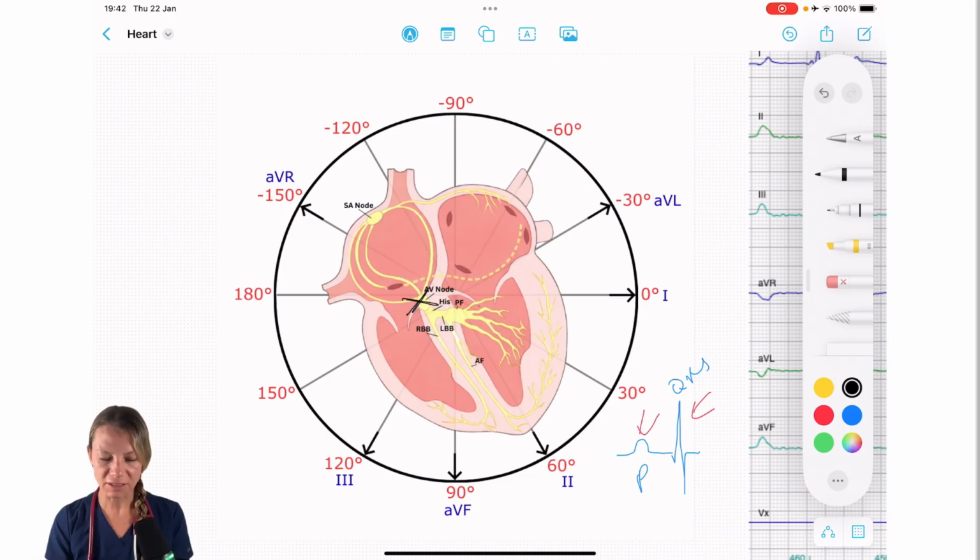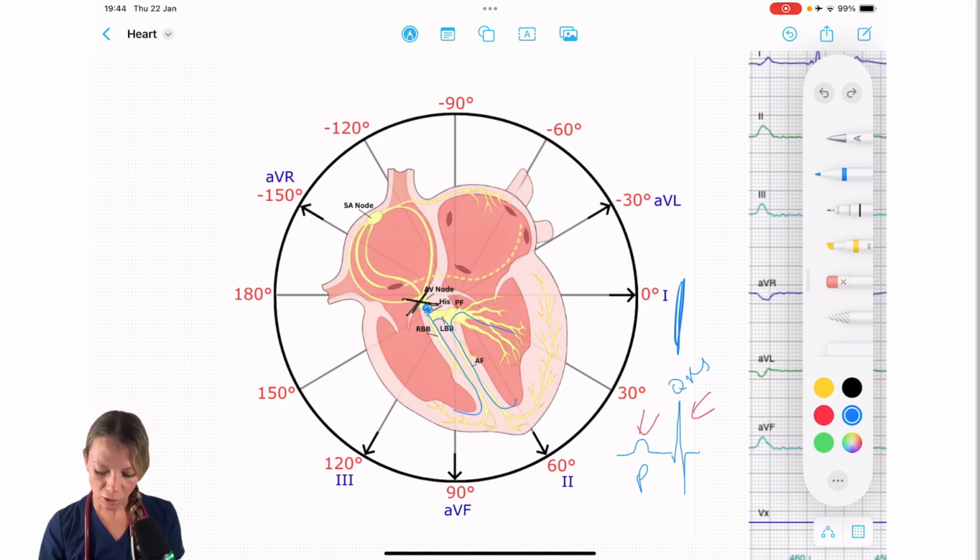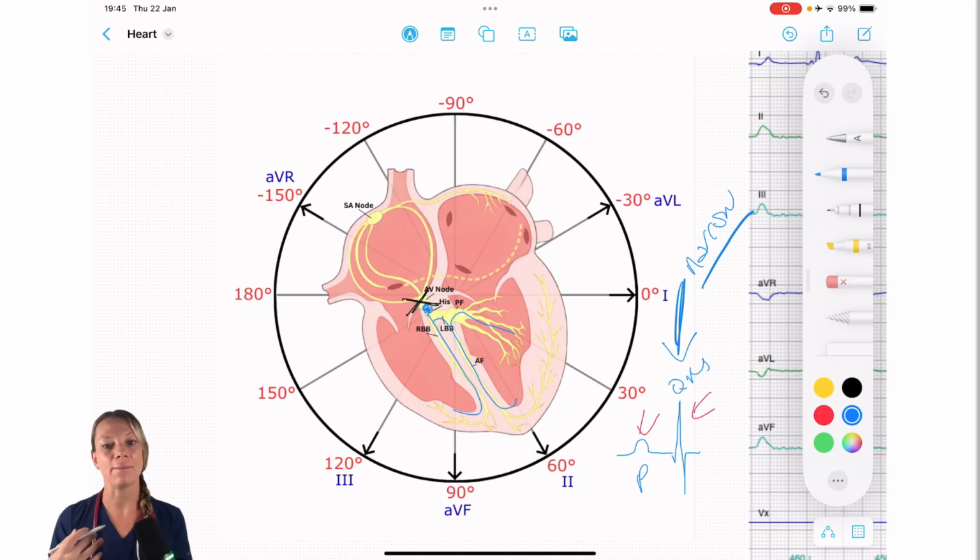Well, when atrial impulses fail to reach the ventricles, ventricular activation depends entirely on an escape pacemaker. In cats, that escape rhythm is most commonly junctional. That means that the pacemaker originates near the AV junction rather than deep within the ventricular myocardium. As a result, ventricular activation spreads normally through the His-Purkinje system, and the QRS complexes are narrow. In cats, the junctional escape rate may appear relatively fast, somewhere in the range of about 100 to 140 beats per minute, compared to what we typically expect in dogs. And that's why complete heart block in cats is often better tolerated than in dogs.